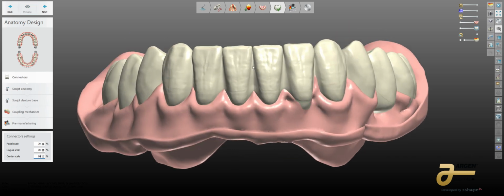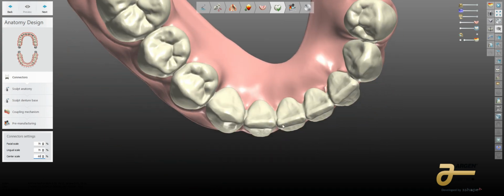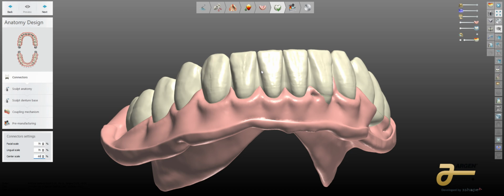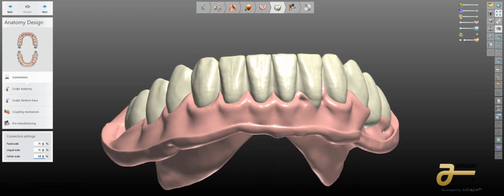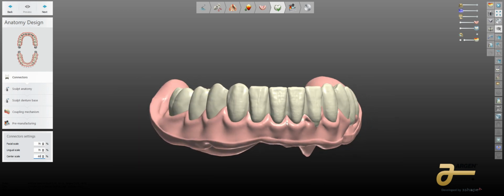You can see the ugliness of the connectors. I would love 3Shape to eliminate that facial connector or minimize it even more, so that it could still be bulked up to the lingual but maintain the shape. There are some tricks you can do when you're setting teeth to leave space in between so the connector comes together, because the bur will never get to these places in this tight format if you're really concerned with this.